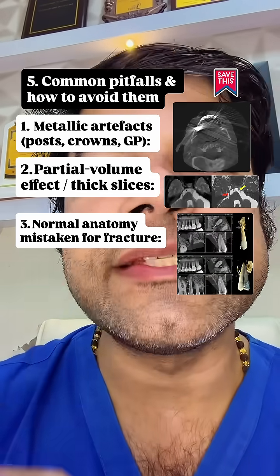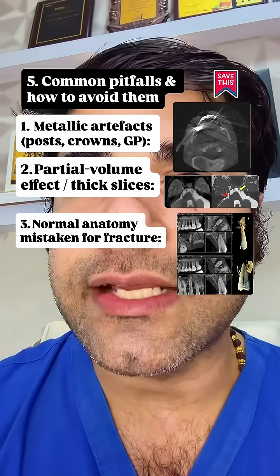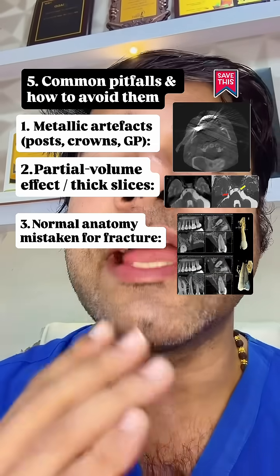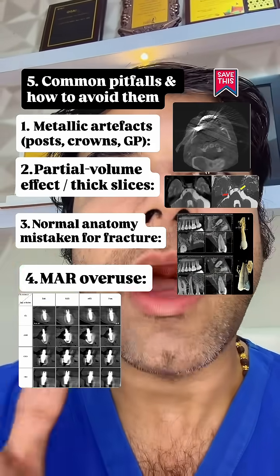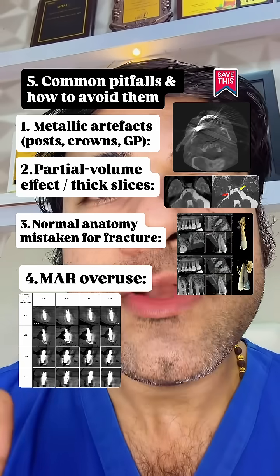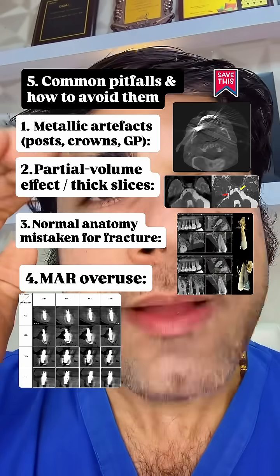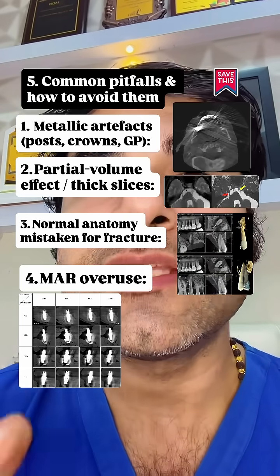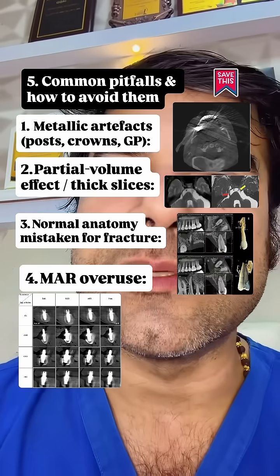Normal anatomy mistaken for fracture: palatal grooves, developmental defects, large accessory canals. Check the continuity of the enamel or cementum surfaces and compare across different planes. MAR overuse: some MAR filters reduce both noise and true fracture contrast, thereby lowering the sensitivity. If the scan was acquired with MAR, examine raw data if accessible.